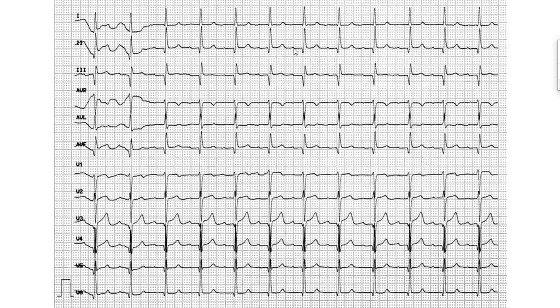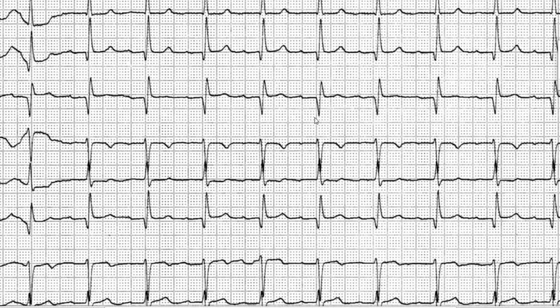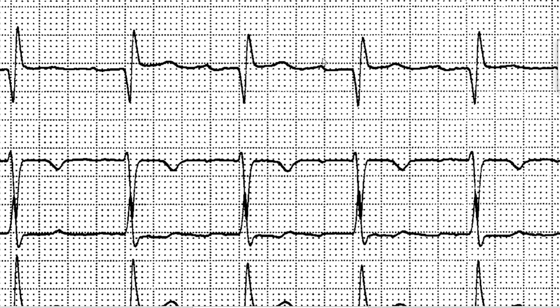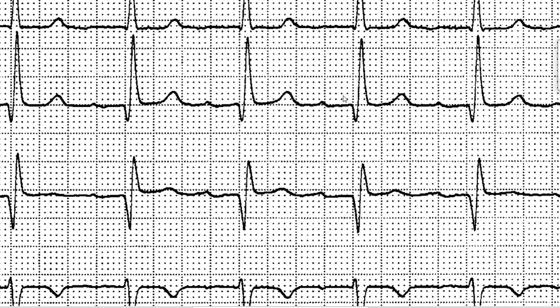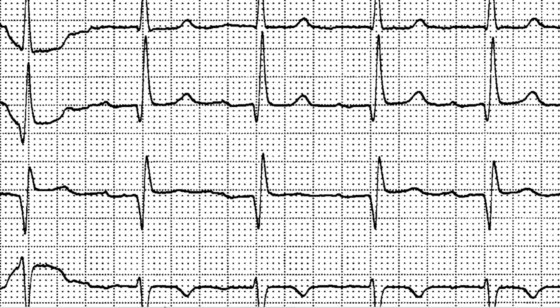0.5 PQ, and we measured that, and that's pretty much the majority of the points. But to check out PQ here, we notice actually 1, 2, 3, 4, 5. 5 times 0.04 is 0.20. Maybe if we check somewhere else, we might even find it to be prolonged. And I want to sort of make that happen because I know what's in the script.